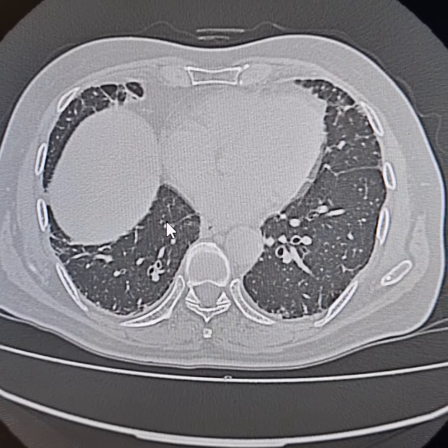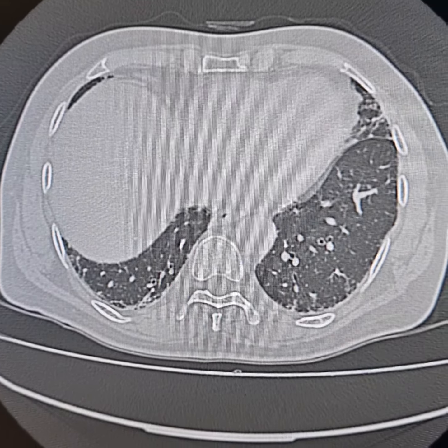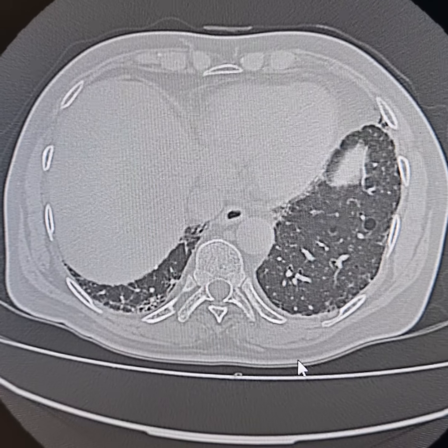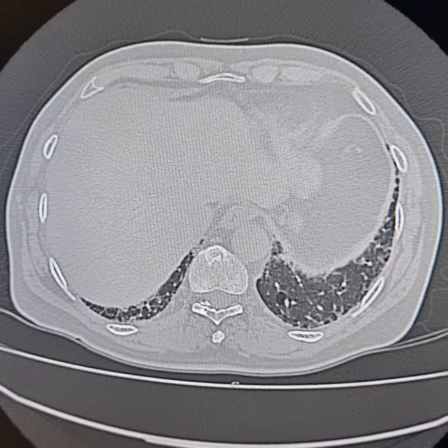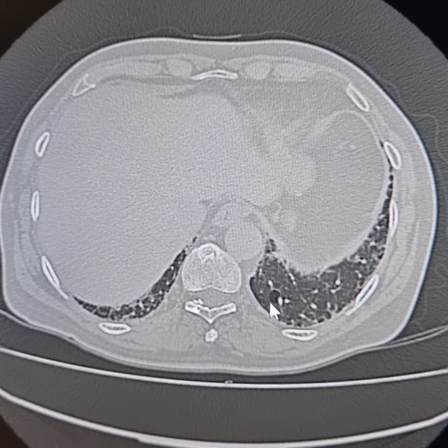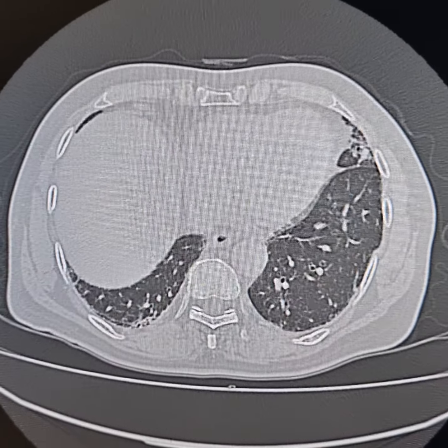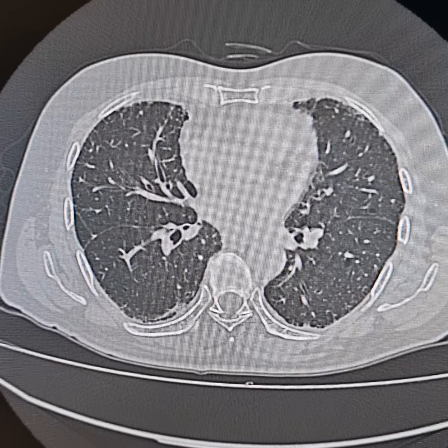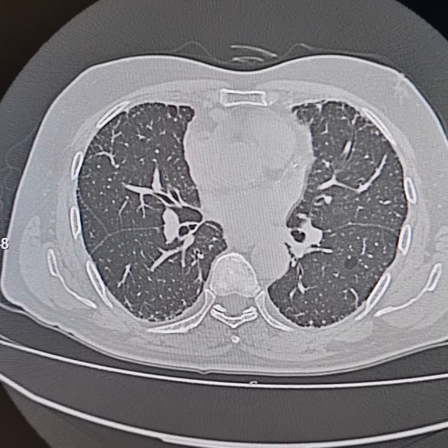The interlobular and intralobular septal thickenings are relatively more marked in the lower parts of the lungs. Please observe these small air-filled lucencies. This one here. Involvement of right lower lobe is relatively more severe. Air cysts inside the lung.